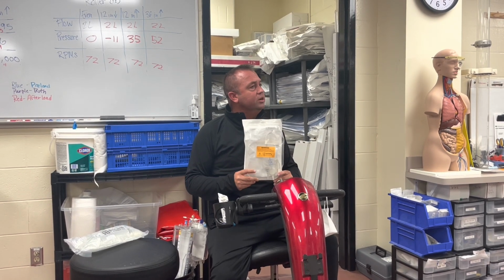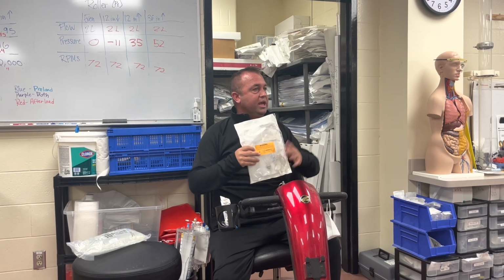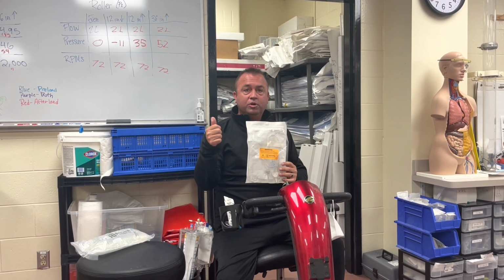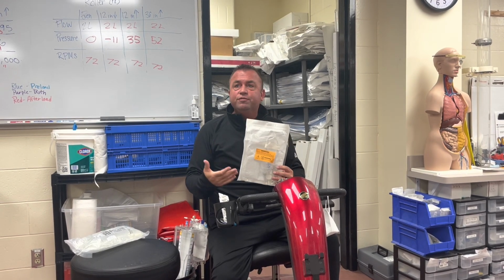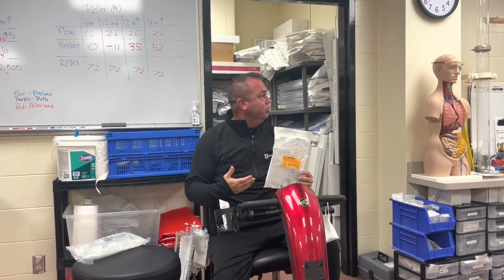So the way these work is we can have an external monitoring system in the OR, or we have one here. We also use these on our heart and lung machines. So we can measure cardioplegia pressure, an arterial pressure, a venous pressure. We can measure as many as 3 or 4 different pressures using the heart and lung machine, whatever we set that up to do.